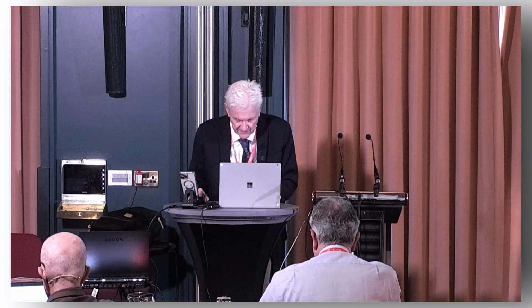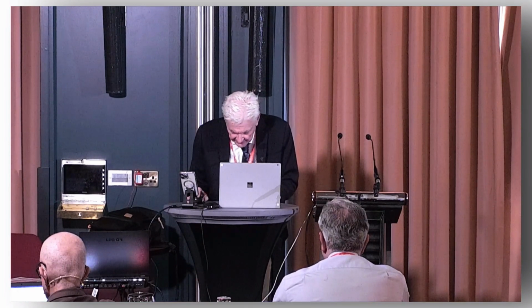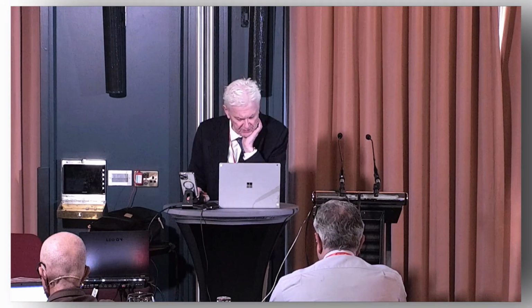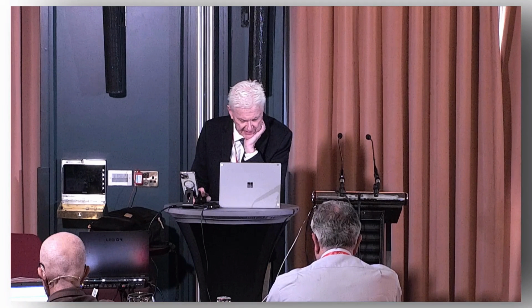Let's open this one. Hopefully that will get me back to where I want to be. So I look at the pulmonary artery velocity on this case. Here we go.